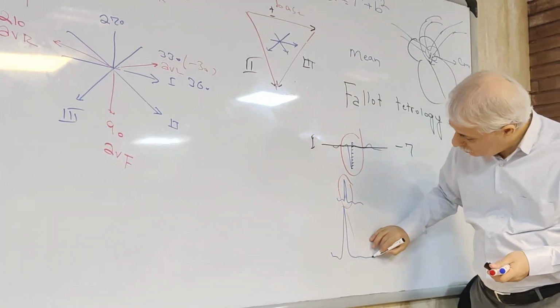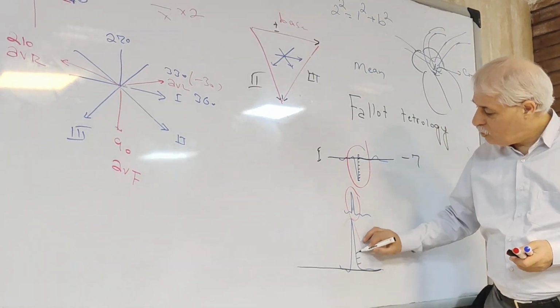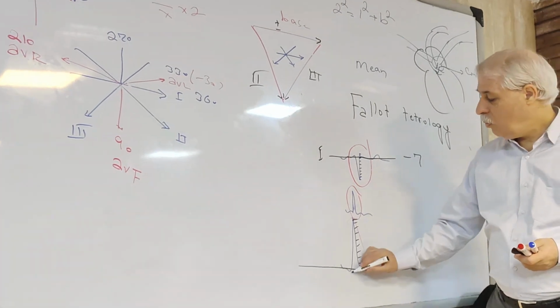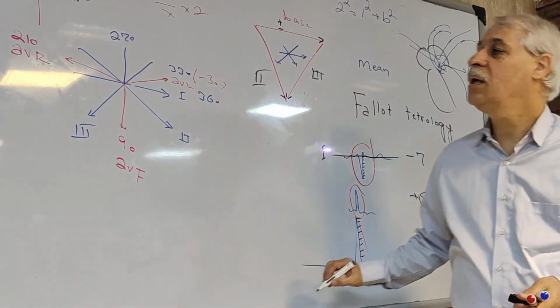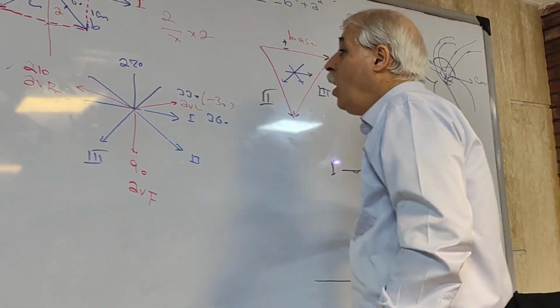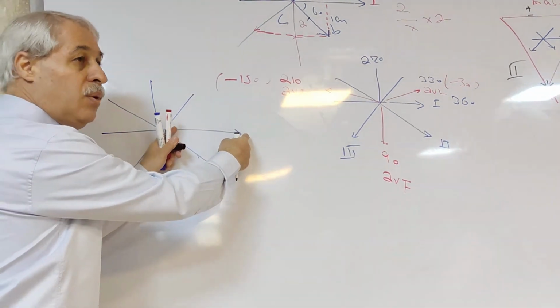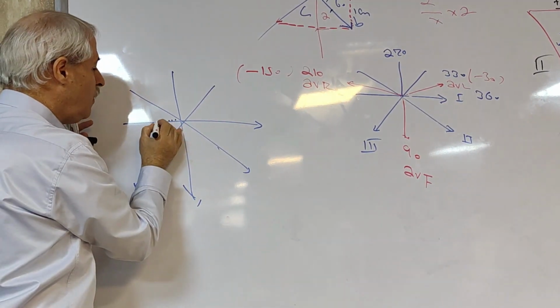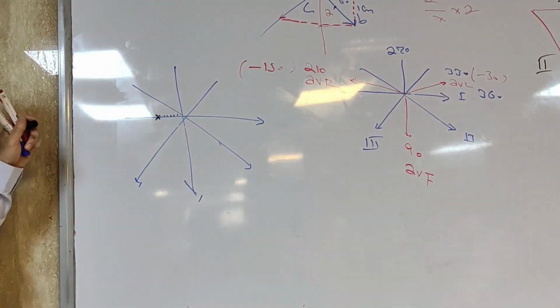What about in limb lead 3? Make a straight line. 1, 2, 3, 4, 5, 6, 7, 8, 9. Positive, 1 negative. Positive 8. Plus 8. See? In limb lead 1, minus 7. This is the positive end of limb lead 1. This is the negative end. 1, 2, 3, 4, 5, 6, 7. This is minus 7.